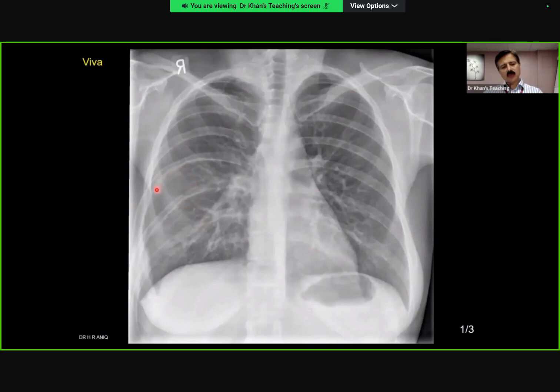Actually, this is not a periosteal reaction. Maybe for you it is projecting like that, so let me guide you. There is no periosteal reaction. What is your conclusion with these ribs? They look quite widely spaced compared to the adjacent ribs either side. Very good. So I think there might be a chest wall mass that's splaying the ribs and causing some reactive sclerosis.